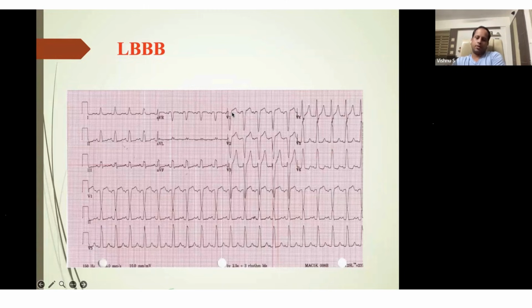That is normal in all patients. So in left bundle branch block, septal activation from left to right is absent. So septal Q will definitely be absent in a true complete LBBB, and the QRS will be predominantly QS with notches on the descending limb of the QRS.